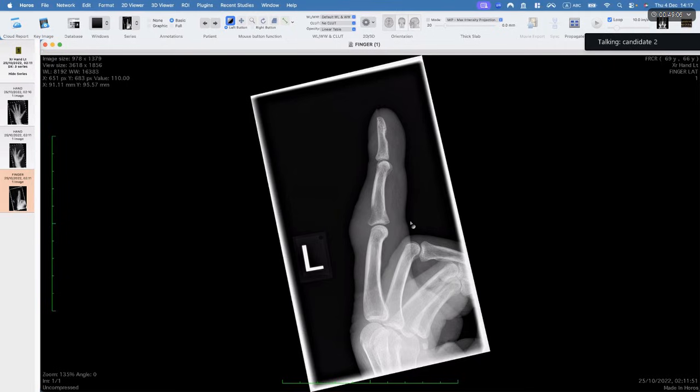So given these features, wherein I can see the cortex is intact, there is no periosteal reaction, there is no expansion of the marrow, and there is a scalloping along the dorsal aspect, I am thinking of a soft tissue or extraosseous pathology, which is long-standing, thereby causing a mass effect over the mid phalanx. Okay. Do you see sclerosis in association with this abnormality?